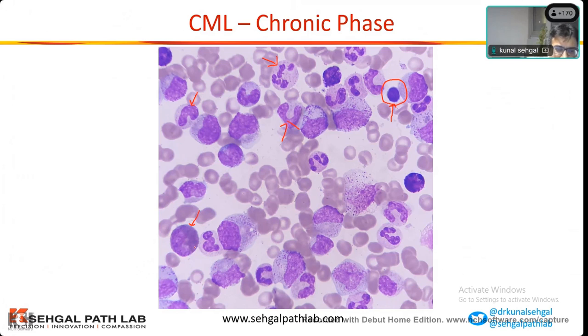Brownish color granules. Blast, sir. Okay. It's a little difficult, but you know, this area is the nucleus. And there's a lot of these brownish color granules. A difficult cell. Ignore that cell. Forget it. Can you tell me what is this cell? Size is of a lymphocyte. It has these blackish color granules. Similar cell is over here. Anyone else can tell me what this cell is? Basophil. Excellent. Basophil. Okay.